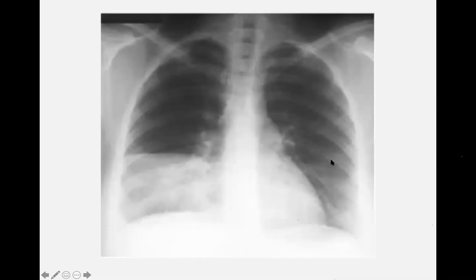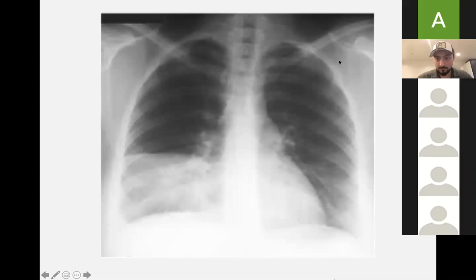Okay, now guys, I have given you the system to start with, so now I want you to actually apply the system and try to go through it in these x-rays. So who can volunteer to start? Who's the brave one who can volunteer to start this x-ray and analyze it? Remember, if you want to learn, you have to practice.